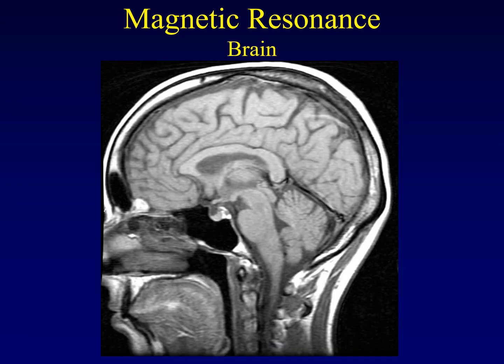Another big advantage of MRI is its multiplanar capability. Whereas a CT scan, a CAT scan, is inherently restricted to the transverse plane, we certainly do some reformatting to overcome that, but it is inherently restricted to the transverse plane. The MRI has no such restrictions. In fact, we could image in any angle, any weird obliquity we wanted to. If I wanted to follow some weird cranial nerve along its path, I could image right along the path or right perpendicular to the path of that nerve.